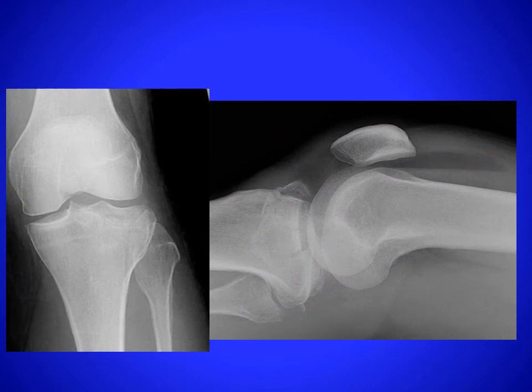This X-ray shows a lateral tibial plateau fracture. The lateral view shows an obvious depression of the plateau. You can also see a joint effusion. It contains a straight line representing a fluid level with lighter fat from the bone marrow floating above and heavier blood at the bottom. This is called lipohemarthrosis.